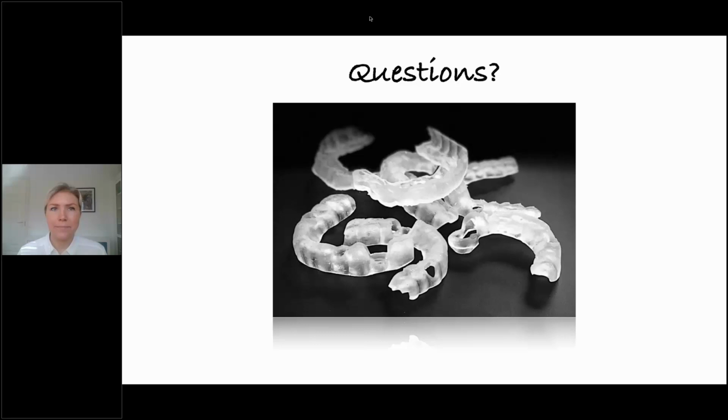Because even though we have scatter, and if you remember that first case I showed, a lot of times you can get pinpoint cuspal data without scatter. So always have your patient in the open bite position, whether it's the bite tab on the CT scanner or a cotton roll. It'll separate the cusps of the teeth, and it will give you enough information that you can successfully merge these.